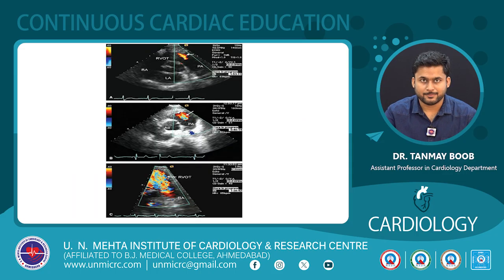As shown in the images, first is mild PR, second is moderate PR and third is severe PR, demonstrating length of PR jet more than 10 mm.